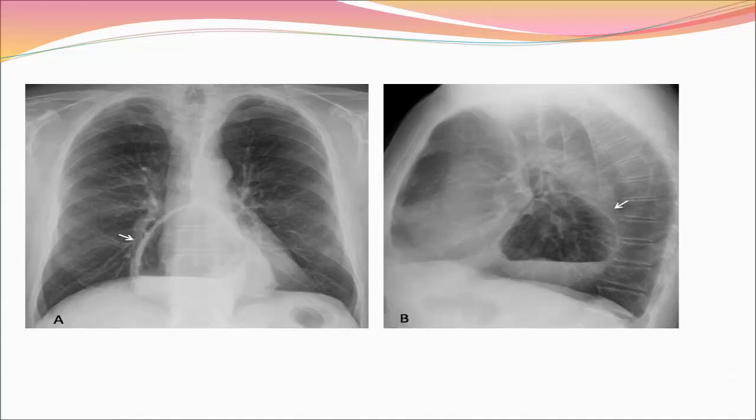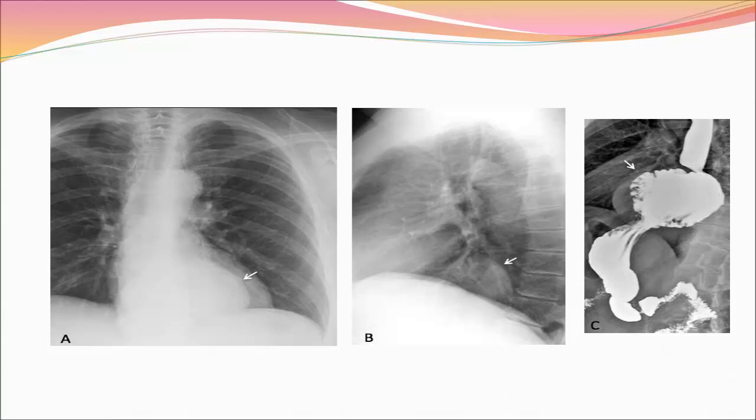By far, hiatal hernia is the most frequent cause of air fluid level in the middle lower mediastinum. It has a typical appearance as in this case and is very common in the elderly. Rounded retrocardiac mass, arrow, located in the lower middle mediastinum in the lateral view, B, arrow. Esophagogram demonstrates an airless hiatal hernia, C, arrow.